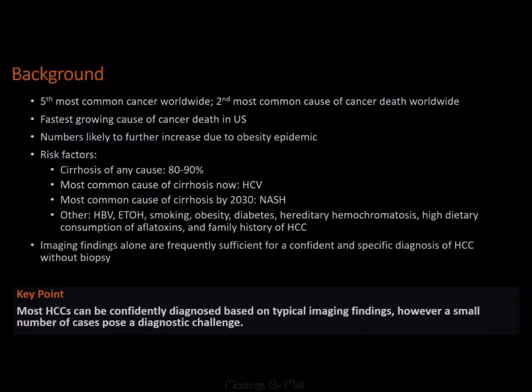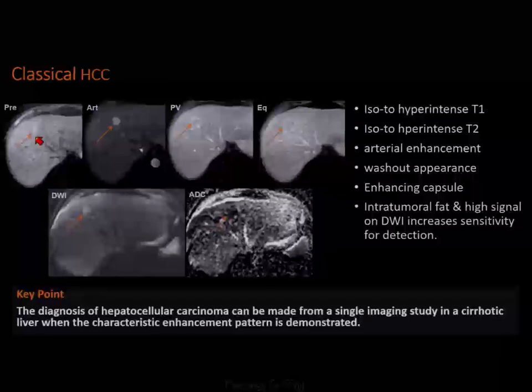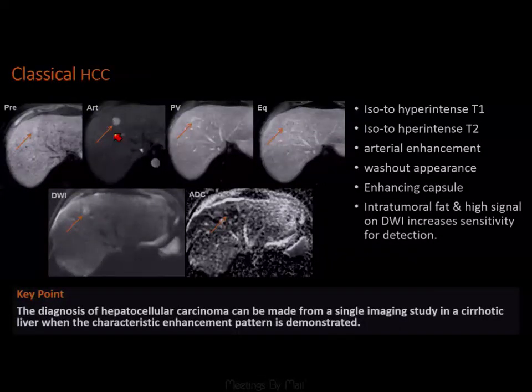And it's very important for radiologists to be familiar with atypical patterns of HCC, what we call LRM with the LIRADS, and understand there are different subcategories, histologic categories of HCC that we might encounter daily. Okay, so you don't have any trouble identifying this as a classic HCC or LIRADS 5 lesion in a background of cirrhosis or chronic liver disease with arterial-enhancing lesion, washout, and pseudocapsule. Obviously, you take into account the size, with or without presence of restricted diffusion or intralesional fat.